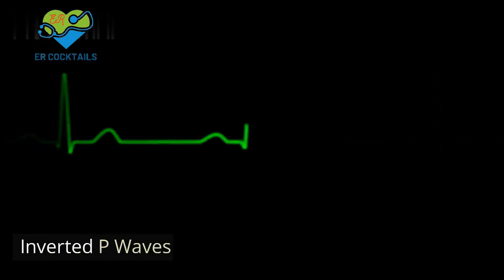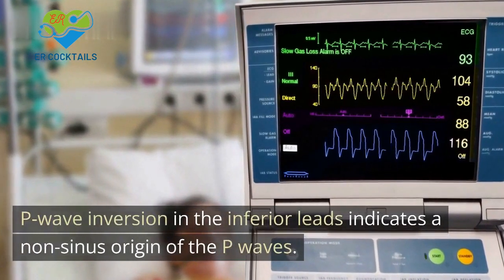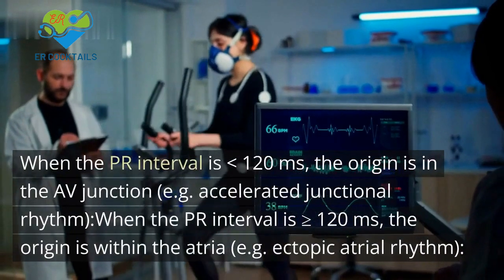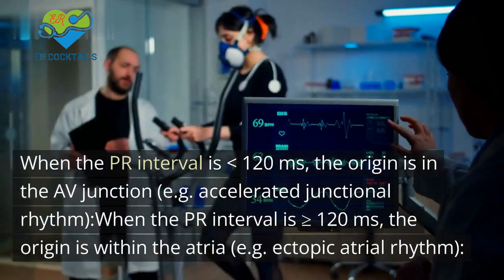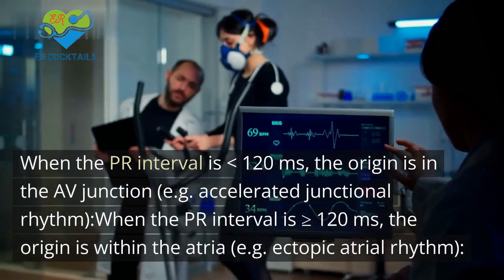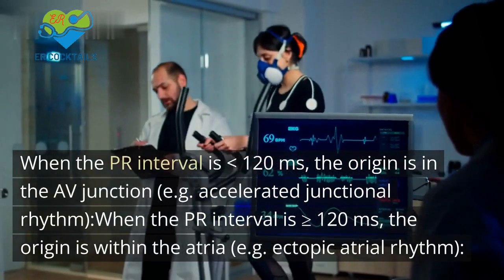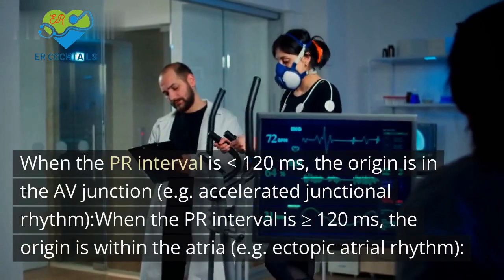Inverted P waves. P wave inversion in the inferior leads indicates a non-sinus origin of the P waves. When the PR interval is less than 120 milliseconds, the origin is in the AV junction, e.g. accelerated junctional rhythm. When the PR interval is greater than or equal to 120 milliseconds, the origin is within the atria, e.g. ectopic atrial rhythm.